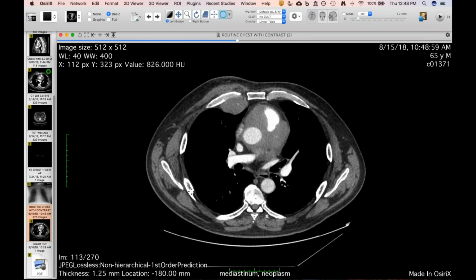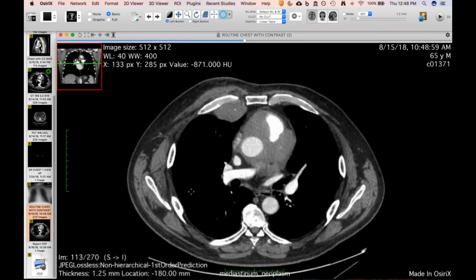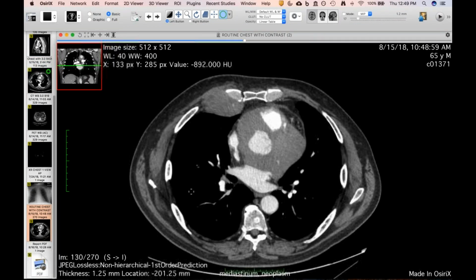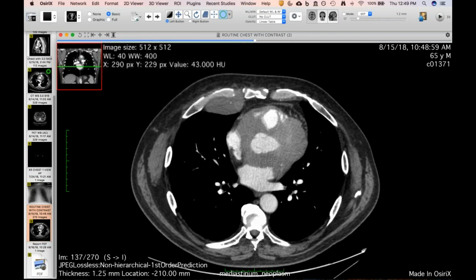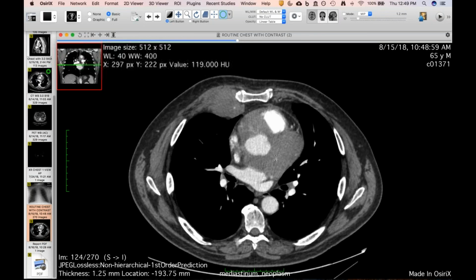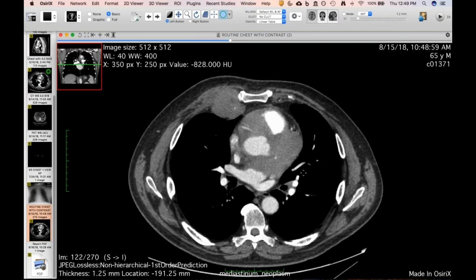I wonder if they did, because we've seen cases of mediastinal masses, big bulky masses, and they didn't find any lymphoma until they looked really hard, and then they found a few Reed Sternberg cells or something like that, driving this proliferation of a whole lot of other tissue. So given a big bulky soft tissue mass like this, I think lymphoma is still top of the list. And we've shown many cases of pericardial and cardiac lymphoma too. So I'm still suspect.